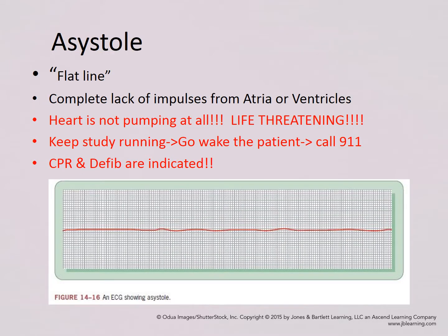Asystole, also called flatlining. This results from a complete lack of electrical impulses from the atria or ventricles. So your heart is not pumping at all. Very life-threatening. Again, keep your study running, go wake the patient, and then call 911.